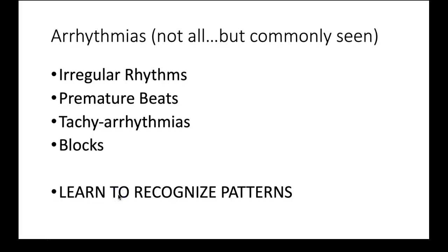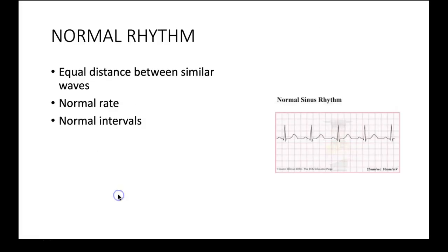Now let's touch upon rhythm. We're going to look at some of the arrhythmias. We're going to look at some irregular rhythms, premature beats, tachyarrhythmias, and some blocks. And the most important thing with recognizing rhythms is realizing that there's patterns. Start to recognize the patterns. It'll make it much easier.